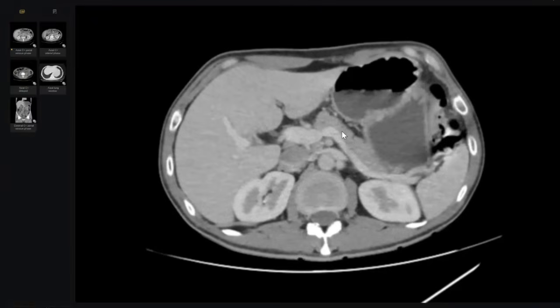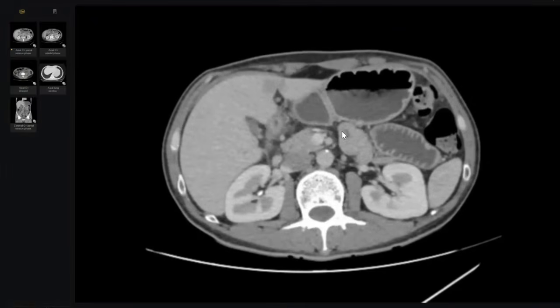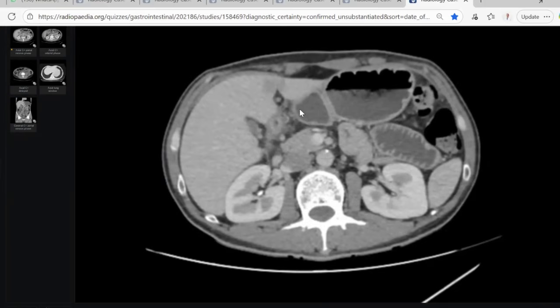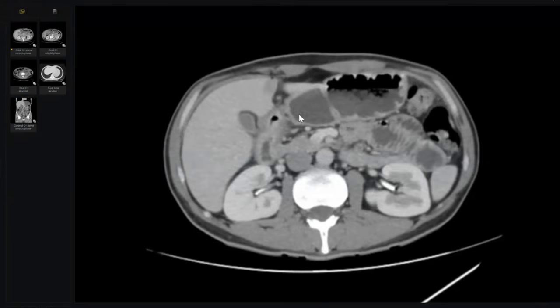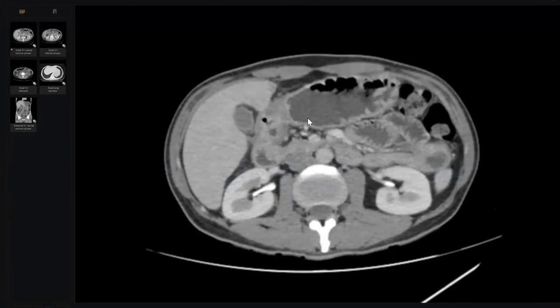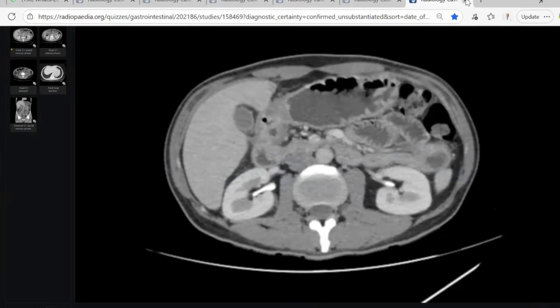Thank you, doctor, thank you so much. Next candidate. By the way, it was a perforated gastric ulcer because, as I told you, here you can tell the examiner first part of duodenum or pyloro-first part junction, not a big deal. Thank you so much. Next candidate.